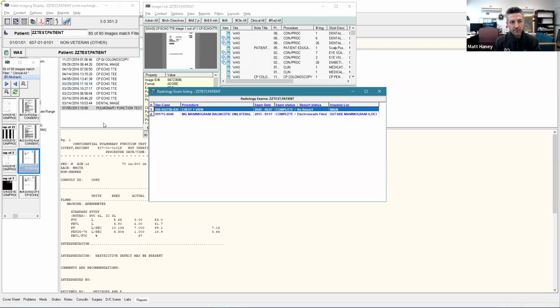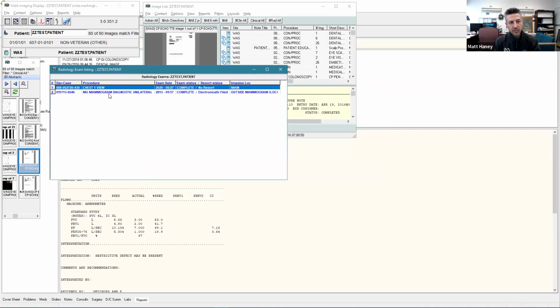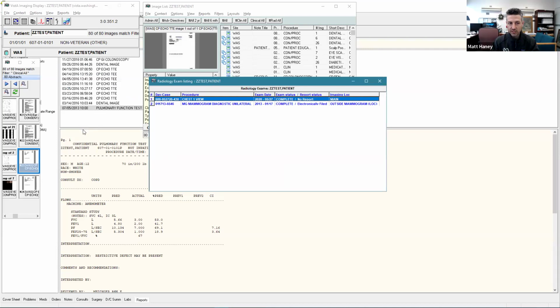and you can again see the thumbnail view. If you then move past that thumbnail and come back to this box with the list in blue, then you can find an old X-ray and double click on it. And it will open up the thumbnail for the old X-ray instead, while still having your image open that you dragged out of the way just a second ago.